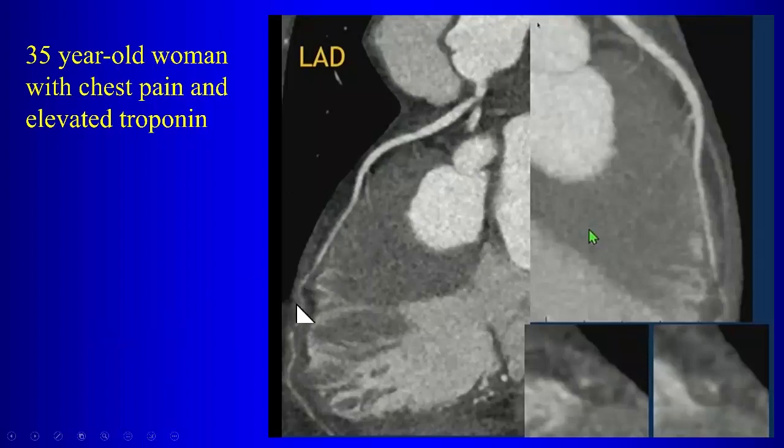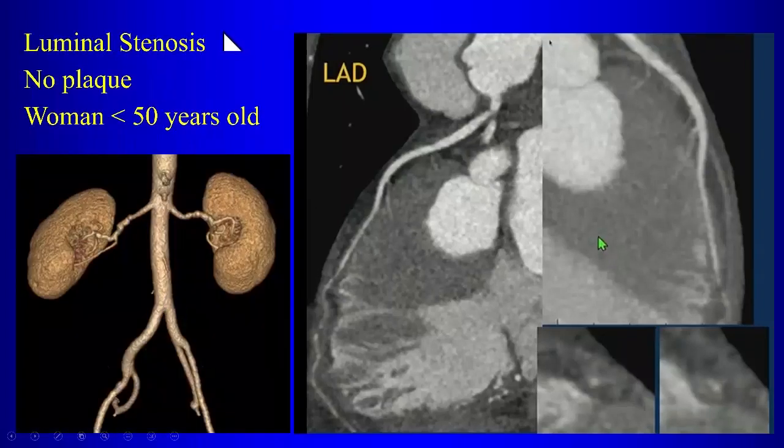So there seems to be this funny looking area here, right, where it looks like there's something wrong? It doesn't look like a well-defined plaque, or a well-defined atherosclerotic obstructive lesion, but there's something wrong here. You're not getting good opacification of this vessel. Then here, when you look in cross section, it does look narrow, but it's hard to decide what is going on here. Well, let me show you this.